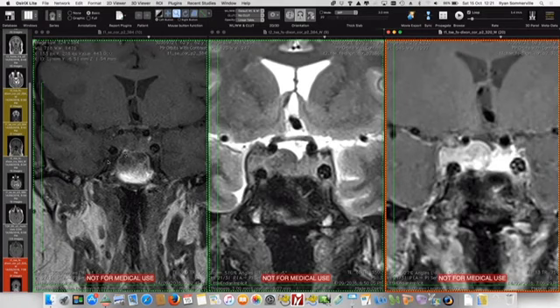And so you get just absolutely torrential bleeding, not to mention the carotid, not to mention all the nerves that are running through there that we can potentially damage. And if you can't see it because there's blood everywhere, then they're at risk. What we can see, though, is that there's a lesion. The CT is completely unhelpful. The bone surrounding is pretty much intact.